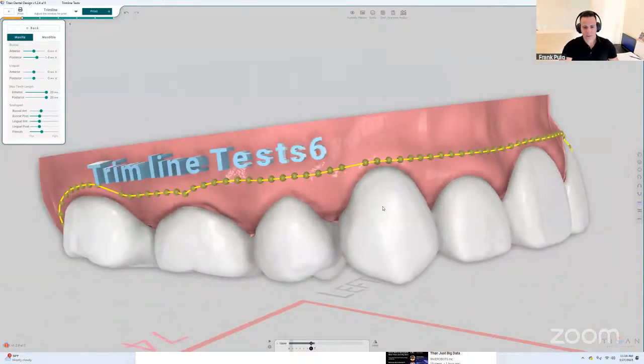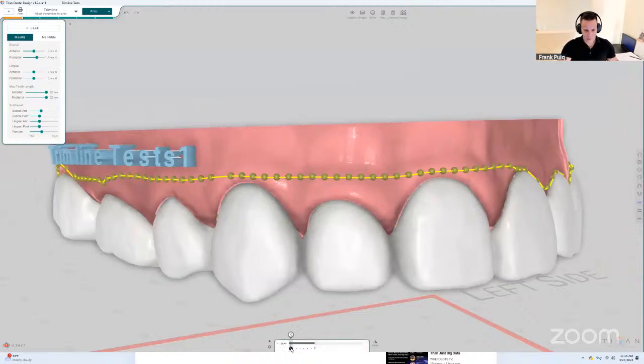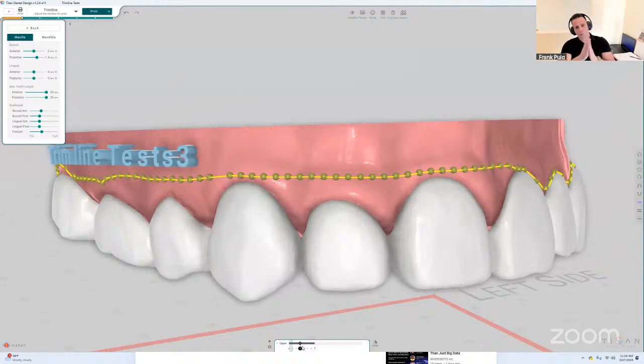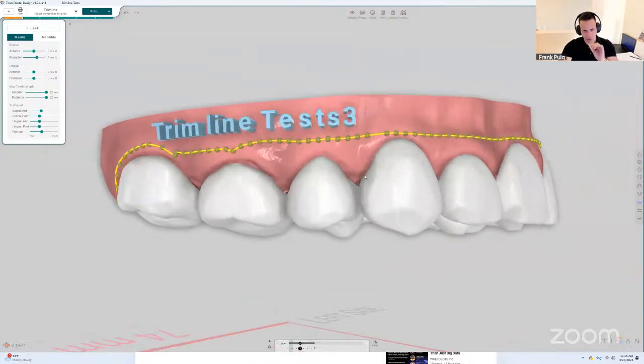This is a better way to handle bigger movements, so bigger adjustments. And the same, the spline will be applied for every aligner. That way you have short controls, smart controls, and bigger controls.